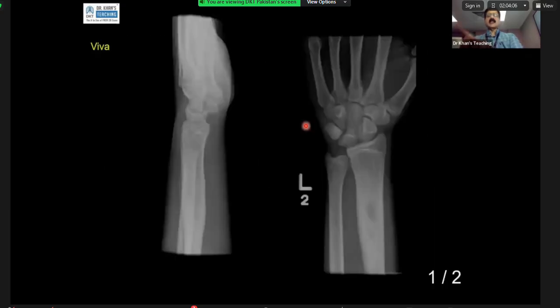Okay, this is the case for which I showed the MR to candidate 1 initially, and I'll again show you the MR, but can you describe your findings here? Yes. It's a classically very good 2B case.